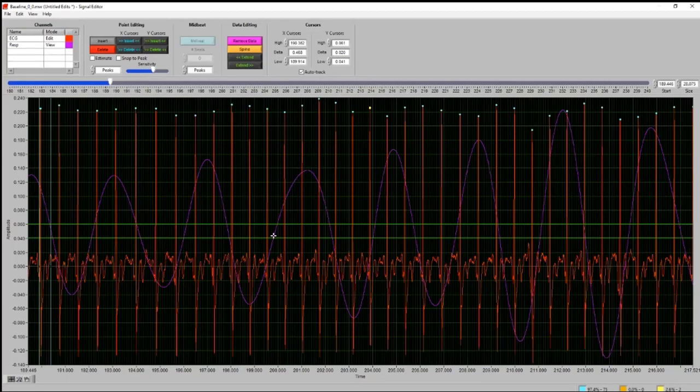So for instance, if we started a respiration inhalation here, over the next course of these seconds, we would expect these beats to speed up. So the timing between these would shorten. And then as they breathe out, there's going to be a little bit of latency, but right around here, we'd expect these IBIs to lengthen. We could certainly get our X cursors and go in and prove this to ourselves. It's not happening in a very dramatic fashion here, but it is occurring.